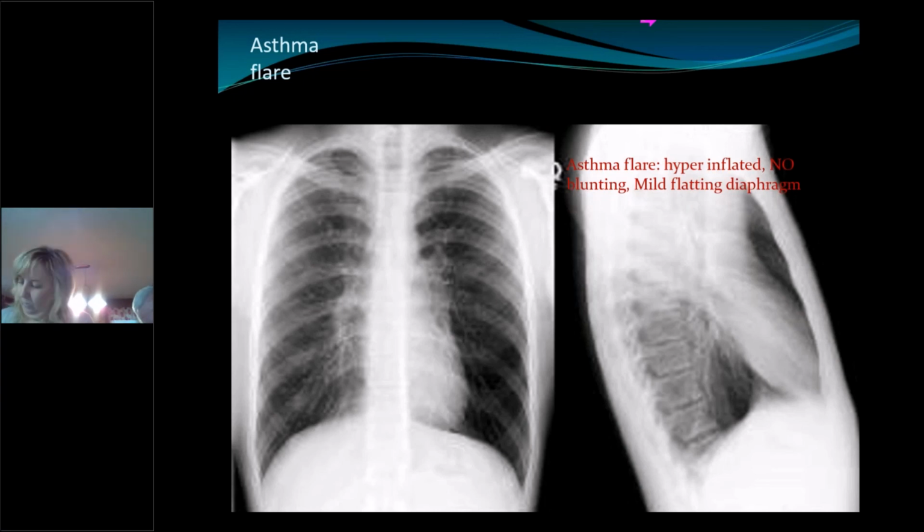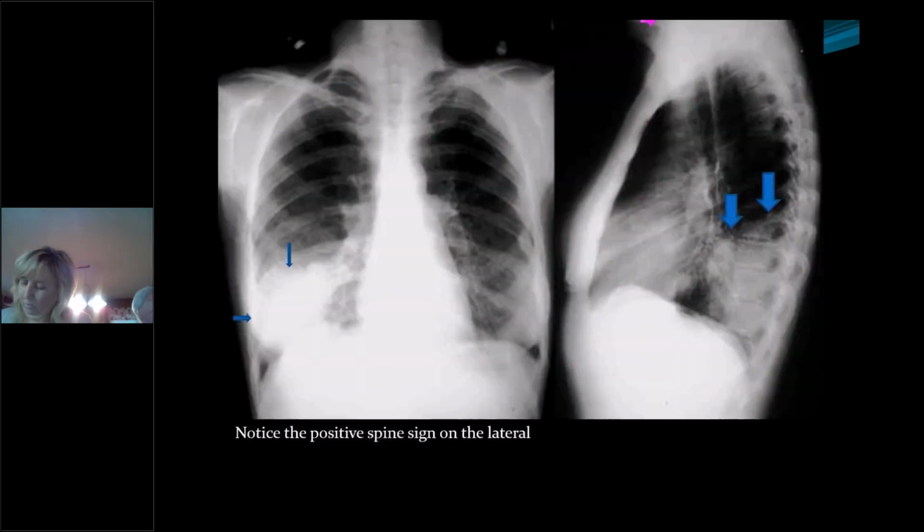And then lastly, what does your patient look like? Is this an 18-year-old kid? The likelihood is he's not a COPDer. If this is a 65-year-old guy who's got leather skin and stained fingers, odds are he's probably a COPDer. So look at your patients, listen to your patients. So this is just a good example radiographically of the differences between those two things.